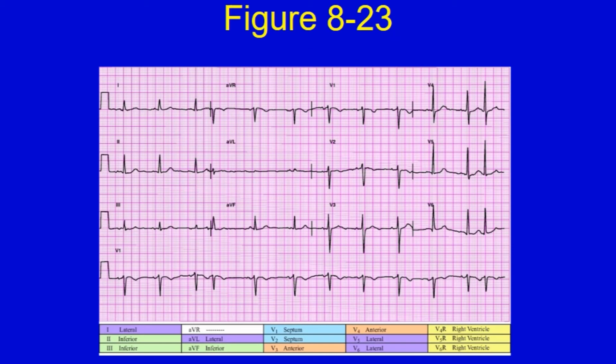Now remember, we're looking at V1. Will the P wave be upright or upside down? It's not a lead 2. That's what we learned how to read so much in, okay? This is V1. I know you do this just to mess with us. Yeah, well, yes, of course I do.